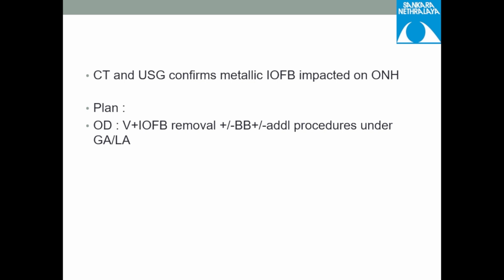To confirm if there are any more foreign bodies, if clinically not visible, and in case the piece is broken into multiple pieces, other places might get impacted. Yeah, there was inferior vitreous hemorrhage. There could have been a piece inferiorly also, so you need to rule that out. And medico-legal documentation also sometimes has a role. Yes, photographic documentation is sufficient, but yes.